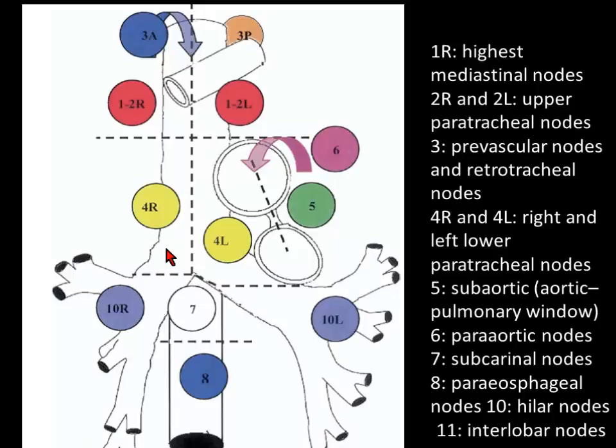This is trachea, this is bronchus. So at the junction of the tracheobronchial, this is a tracheobronchial lymph node. But if you are going to be very specific in chest, then you have to mention the stations, and the physician knows what you are talking about. So this is the bronchus going into the lungs, and that's the hilum. So these are the hilar nodes, right and left. This is the bifurcation, and this is the subcarinal region.